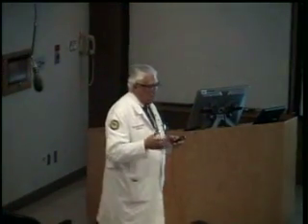A guy, Roy Riascos, is in Houston, and he had it on his phone, and he received all the stroke patients with Rapid, with this software. And you see the slice of the brain, the CT, with the green area that indicates the penumbra. I don't know. So this is it, do you have some questions about this?